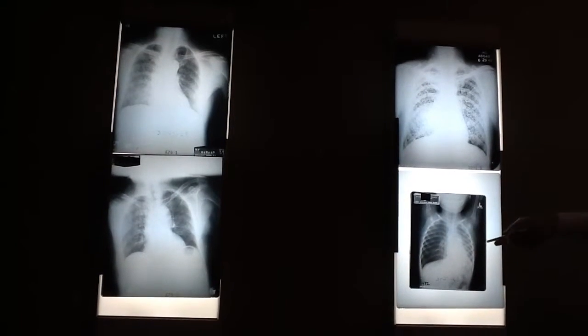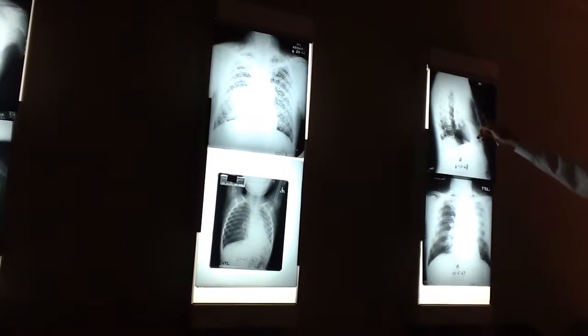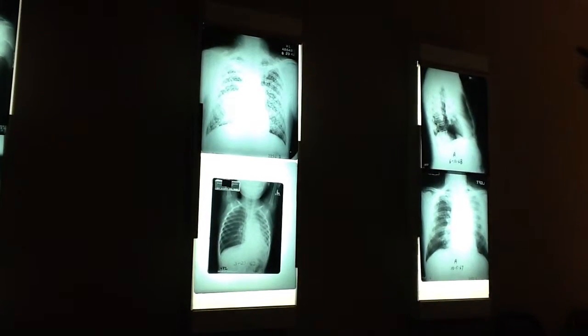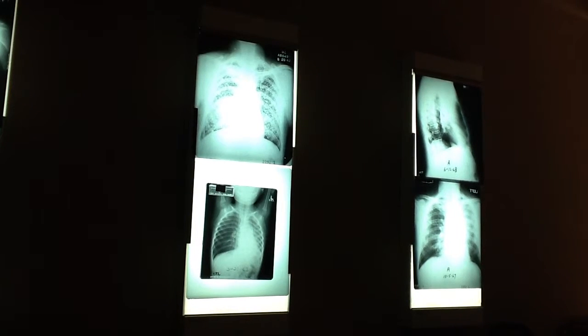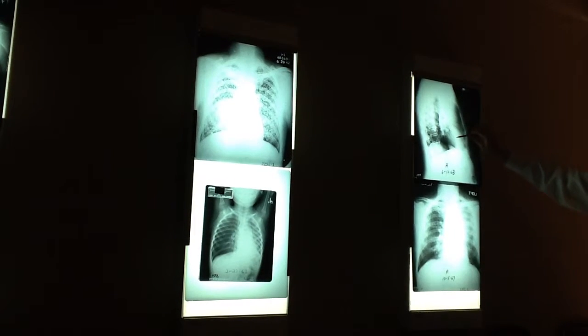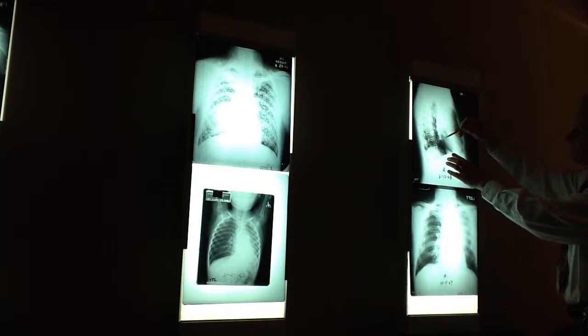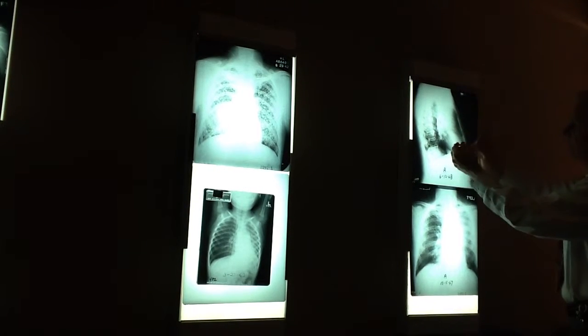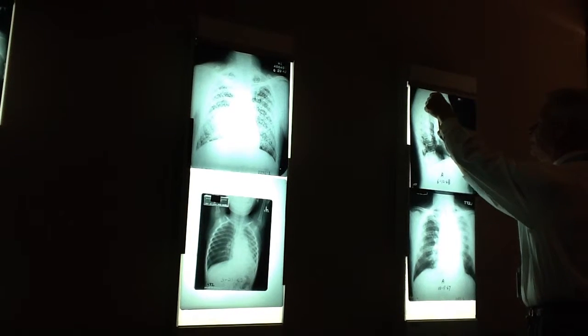This was a resorption atelectasis. We already looked at one of those over there. This was also resorption. This one's exactly the opposite of the one by the door over there. One by the door was left lower. This is left upper. There's the major. We even know where it should be because there's the one on the other side. So it went from here to here and from here to here.